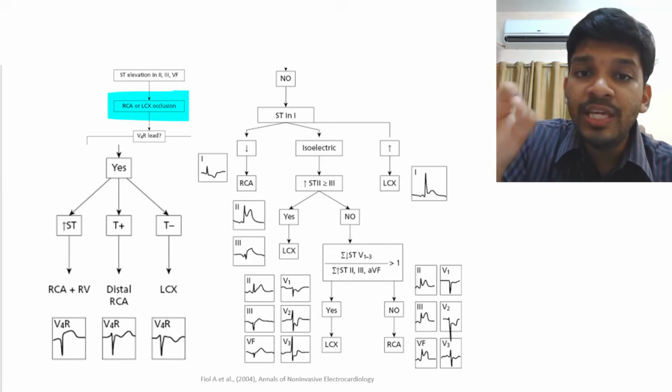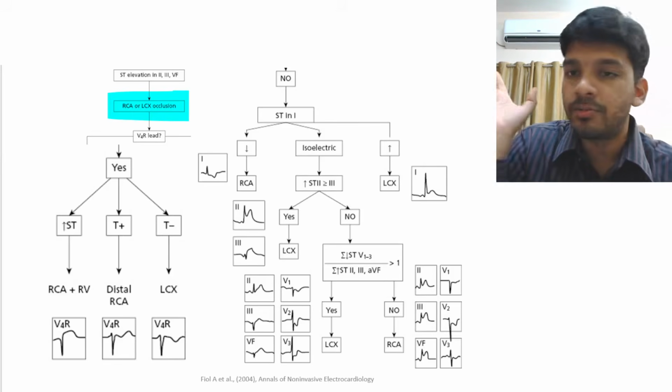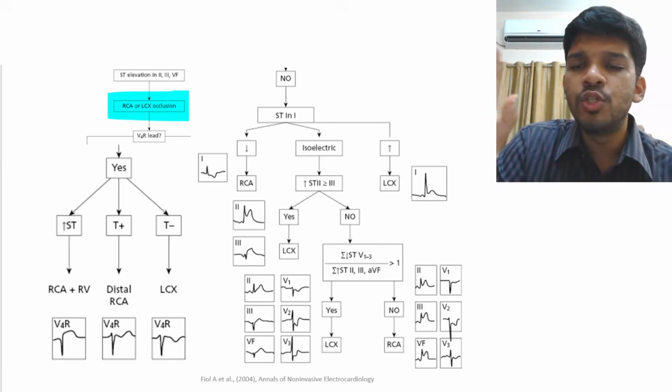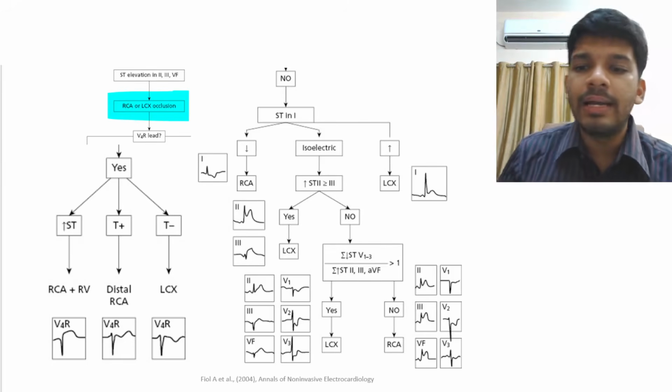Then you will look at the V4R lead. You will look at the lead that is V4R, whether it is available with you or not. Most of the times we assume it is not available to us. Just a small scenario in case you have a V4R lead.